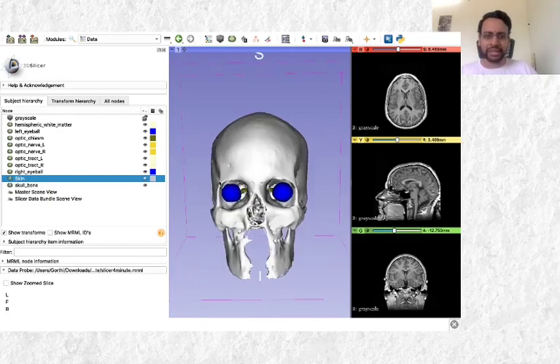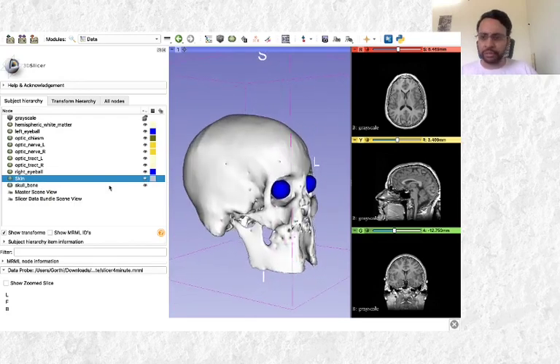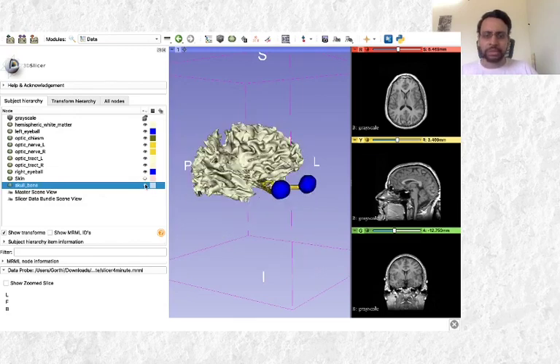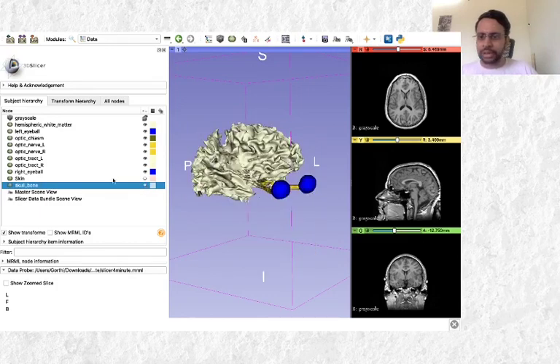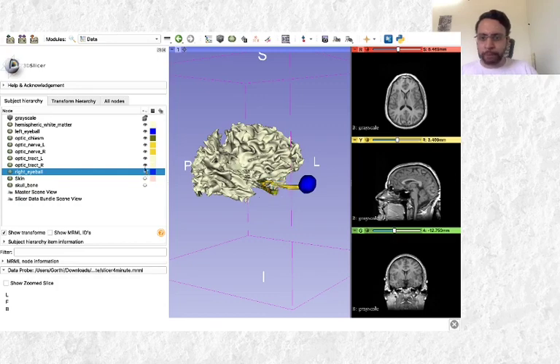If I hide it, these are the volumes that I could see. And skull bones, so this is the skull bone that I am hiding and removing here. And then you could let me hide it for a moment. Then this is the right eyeball. Okay, there should be a left eyeball here. This is the left eyeball.